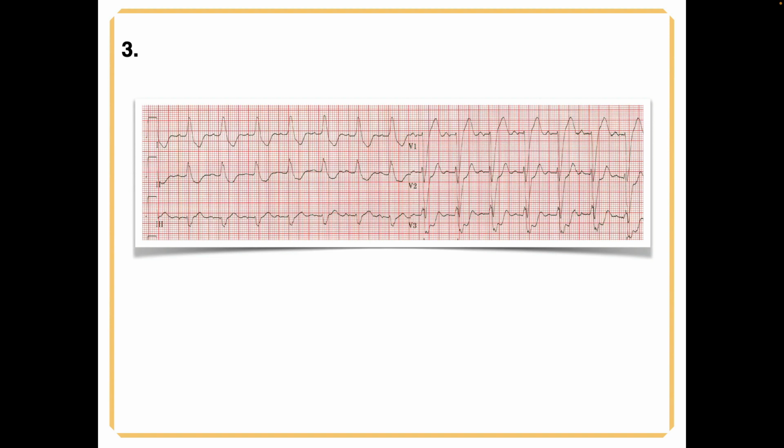Okay, so Anne, number 3, please. I do have ST depression in V2 and V3.